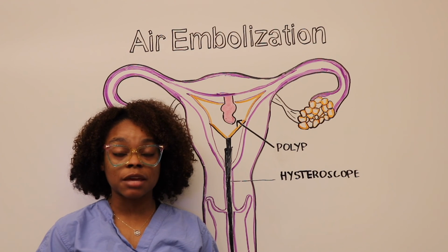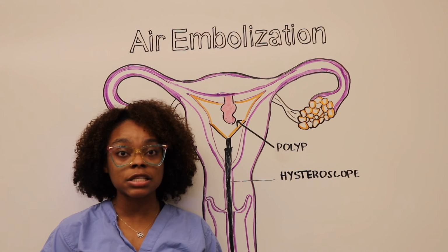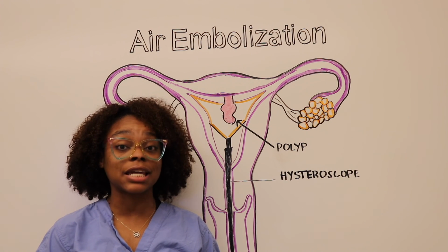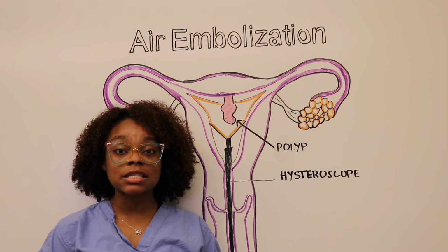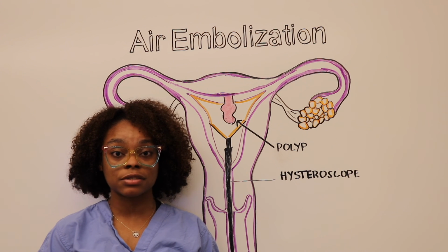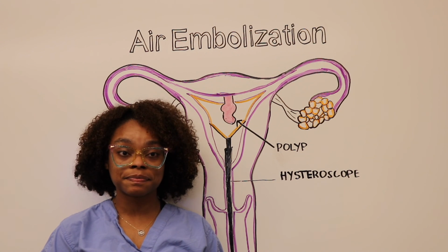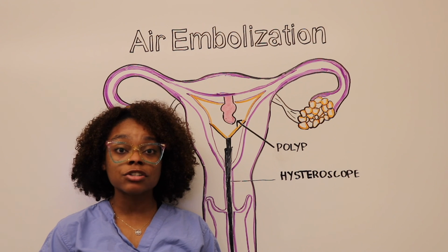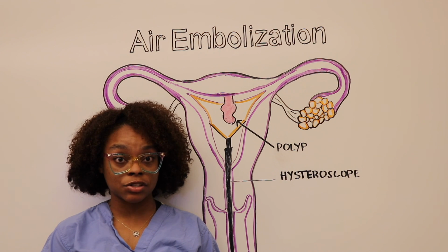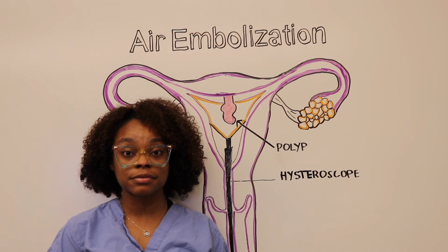Air embolization can be prevented by purging or flushing air from the inflow tubing prior to the insertion of the hysteroscope at the beginning of the procedure. This process should be repeated anytime the inflow fluid bag is changed. Intrauterine pressure should also be monitored and limited. Additionally, providers should avoid repetitive insertion of the hysteroscope through the cervix. This can introduce air into the uterus.